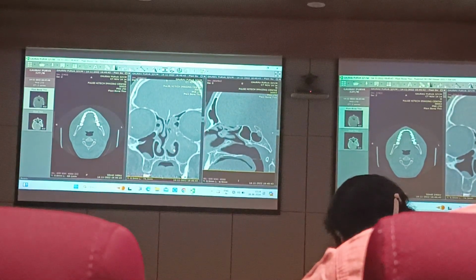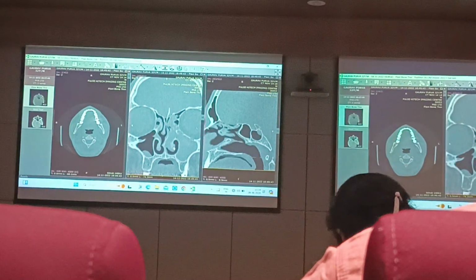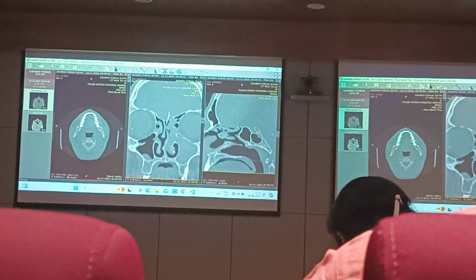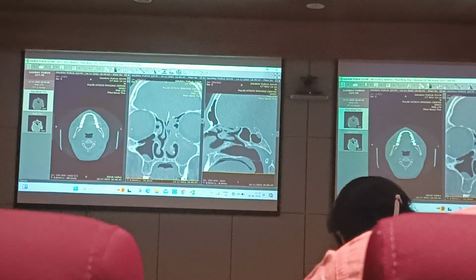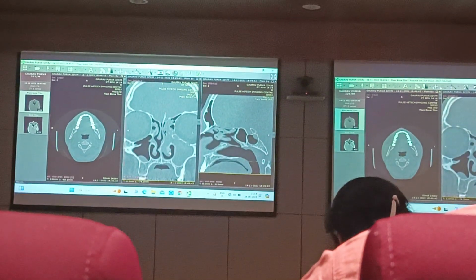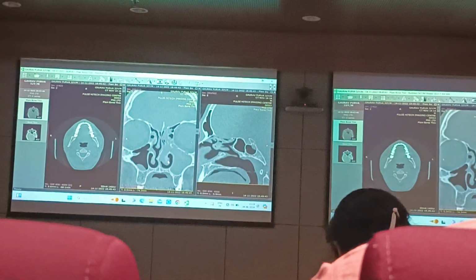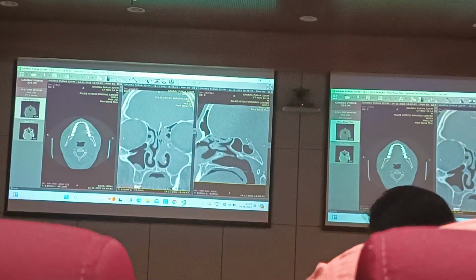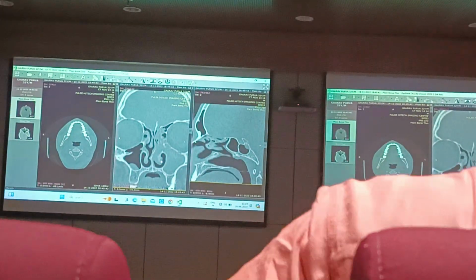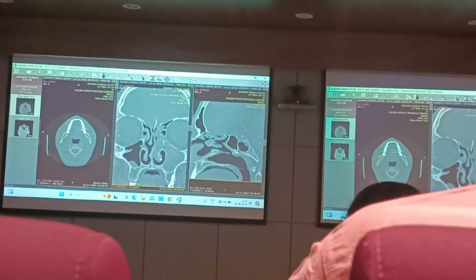So what I mean to say is, in short, never biopsy in today's world. Even CAs of any one of the sinuses are never biopsied straight. We do a CT, then an MRI, make a provisional diagnosis, and if we feel it's a CA, then we biopsy. We never biopsy without having a provisional diagnosis in our mind. Okay? If I want to figure out whether this is inverted papilloma versus CA, then I could biopsy. Is that clear? So this is the finding.